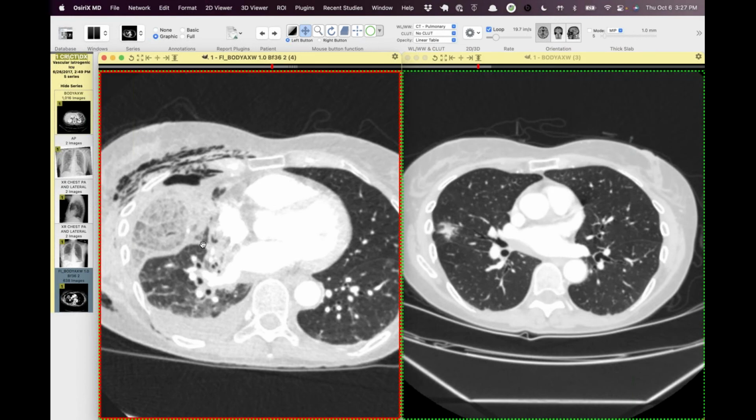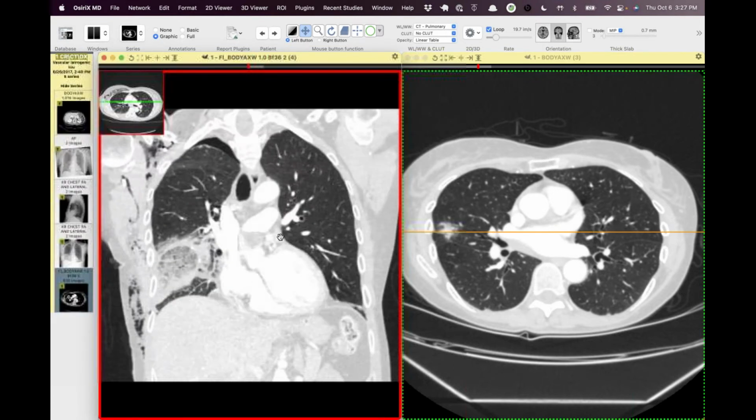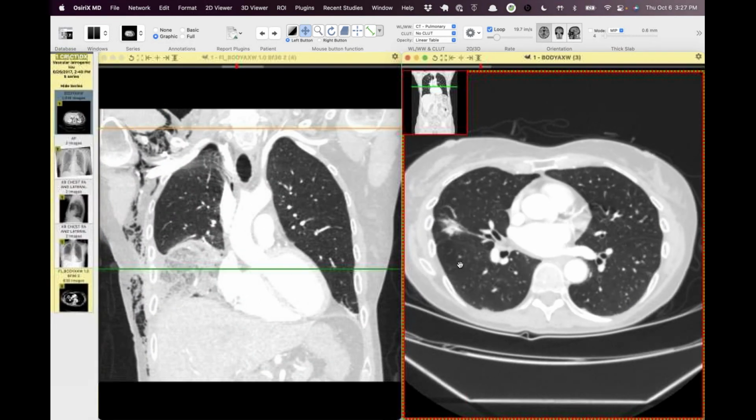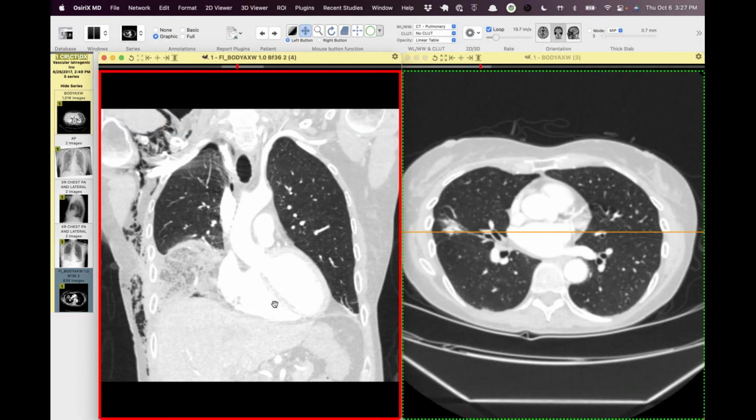I can look here and show you. She just looked like normal pulmonary venous anatomy, with her right middle lobe pulmonary vein coming off separately, but no big deal there. So I don't know. I think when they're working in tight spaces with a thoracoscopic approach, sometimes it's hard to identify all the planes.